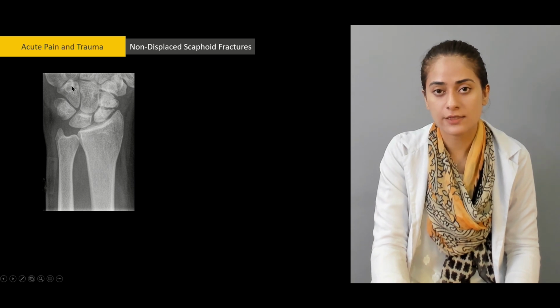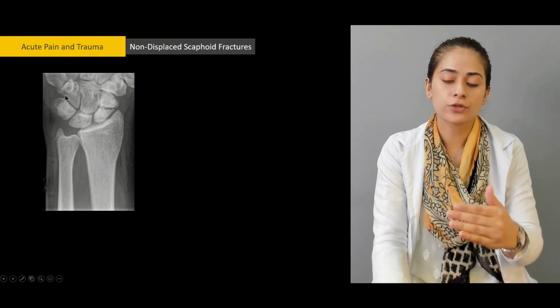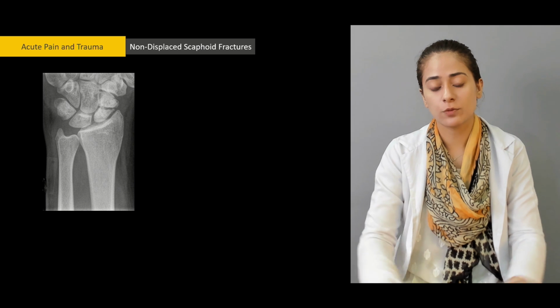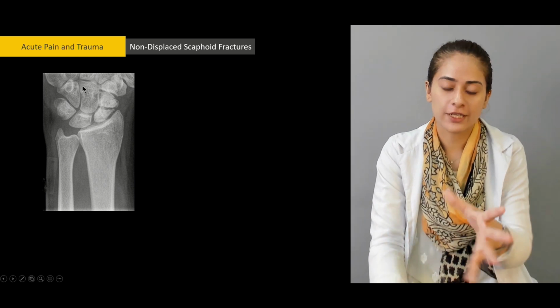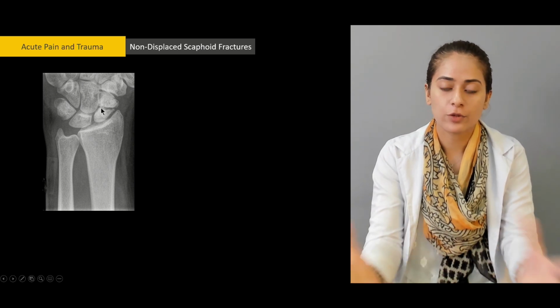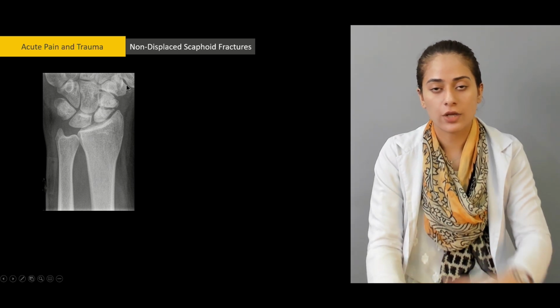So this is the last, the 8th carpal bone, or the last of the 4 of the distal row of carpal bones. So I hope carpal bones can now be labeled on a radiograph by everybody who is looking in or listening to this lecture. This is how the placement of carpal bones is visualized on an X-ray.